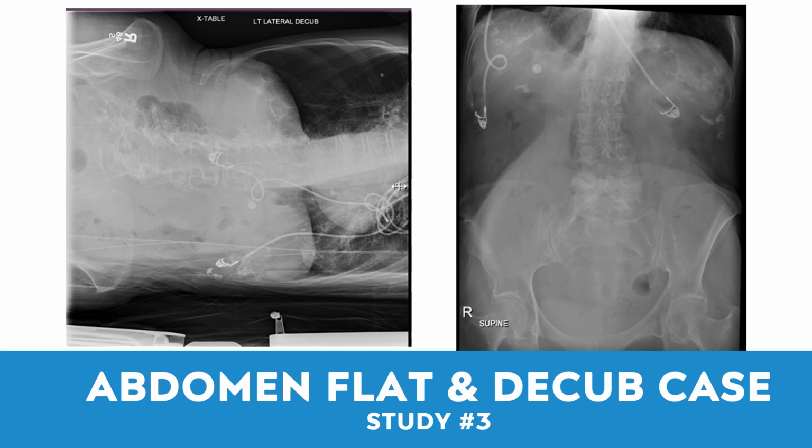As you can tell on the decube, you can see a little bit of the artifact from the bed that the patient was laying in, going across the whole abdomen. Centering looks pretty good. Looks like they performed a left lateral decube, which is what we need for abdomen. And a supine x-ray has also been ordered.